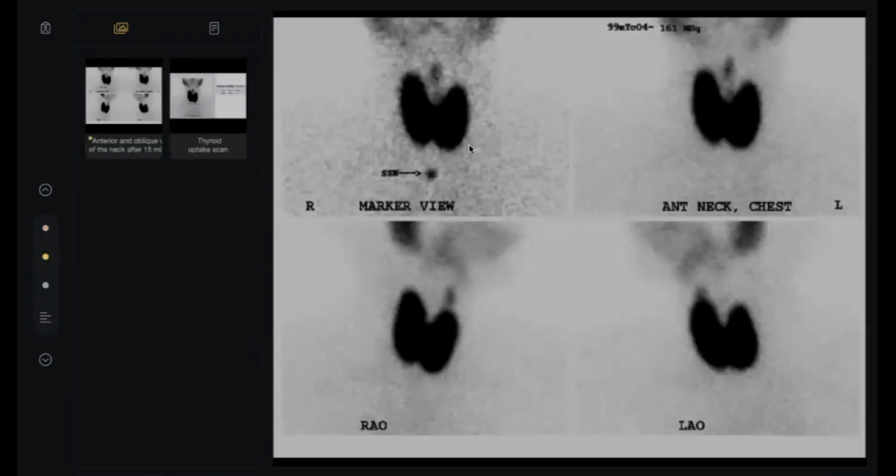Excellent. What is this? This is a thyroid scan. It shows increased uptake in both thyroid lobes. Homogeneous, diffuse, or not? Yes, it is homogeneously, diffusely involving both lobes and isthmus. This buzzword is very critical. Why? Homogeneous diffuse means Graves.